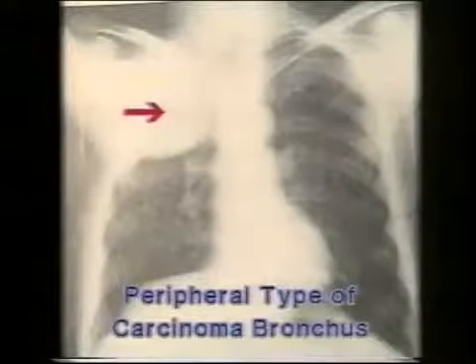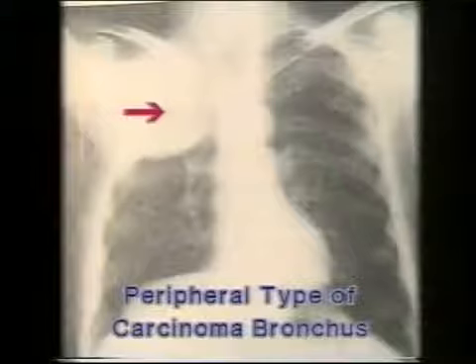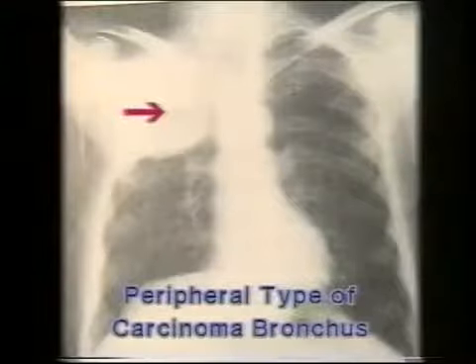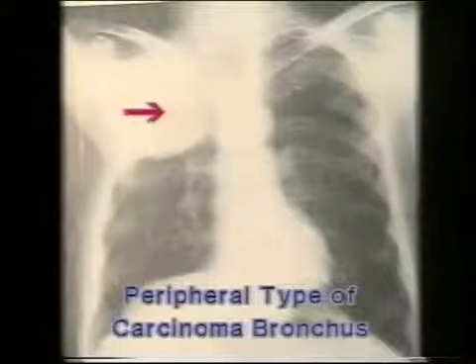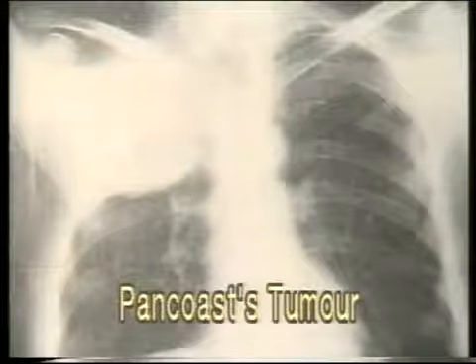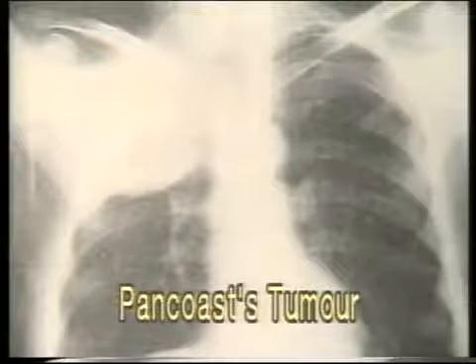A peripheral type of bronchogenic carcinoma affecting the upper lobe, eroding and destroying the upper ribs and affecting the brachial plexus at the root of the neck is termed as Pancoast's tumor. Note the dense opacity in the right apex with rib destruction. The patient had presented with weakness of the right arm. This was a case of Pancoast's tumor.